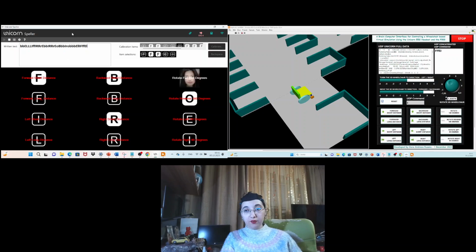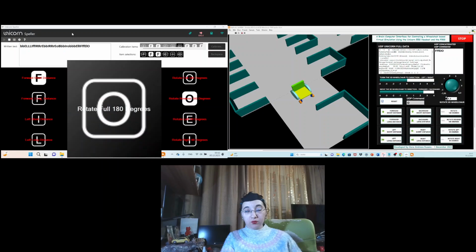Then rotate full 180 degrees. Really nice.